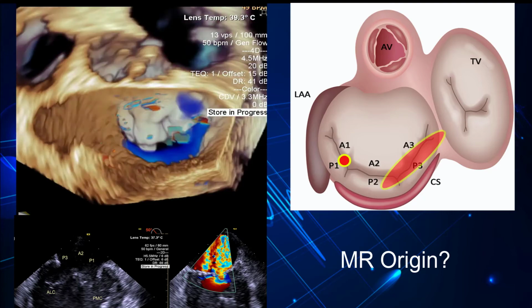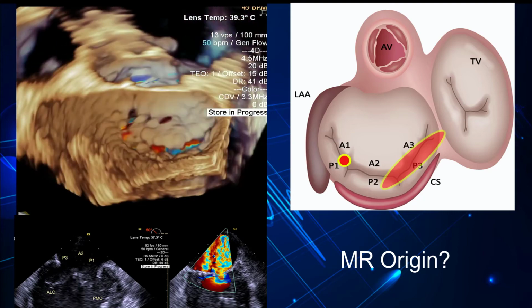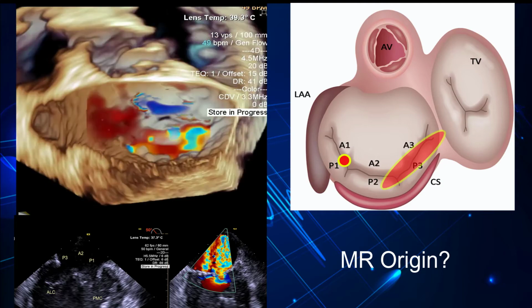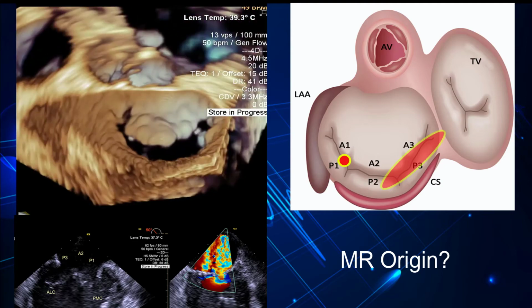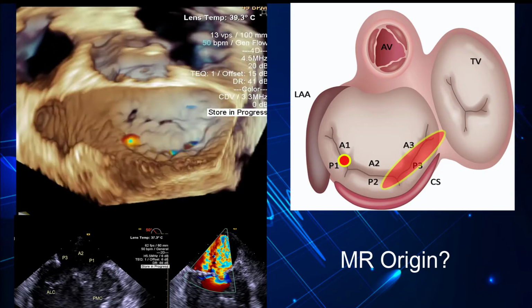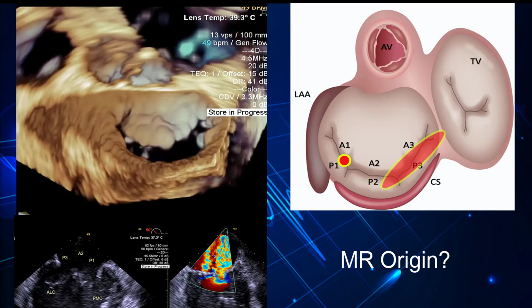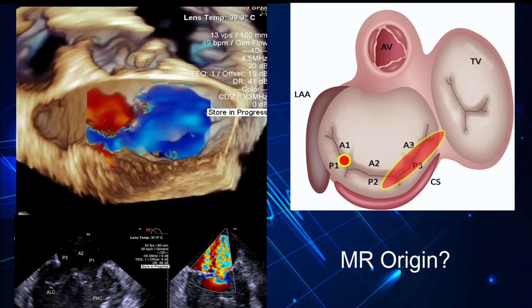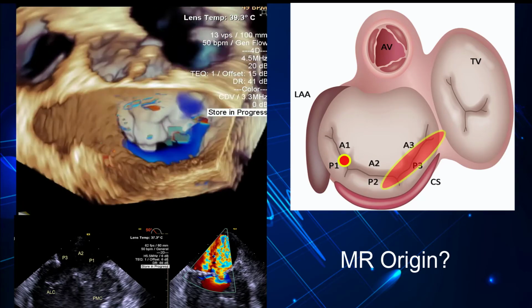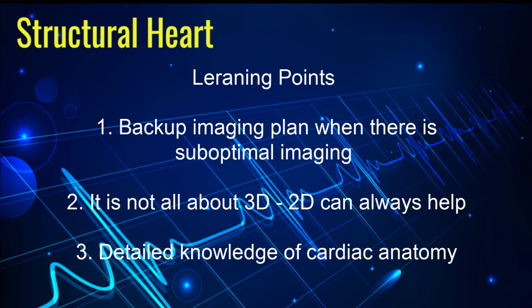Yeah, no, I would agree with that. And the image on the right, you can see the real elliptical shape of the jet, which again is in keeping with ischemic regurgitation. So that image on the right really highlights it's a broad-based jet, elliptical in shape, coming from the medial aspect of A2P2 into A3P3.